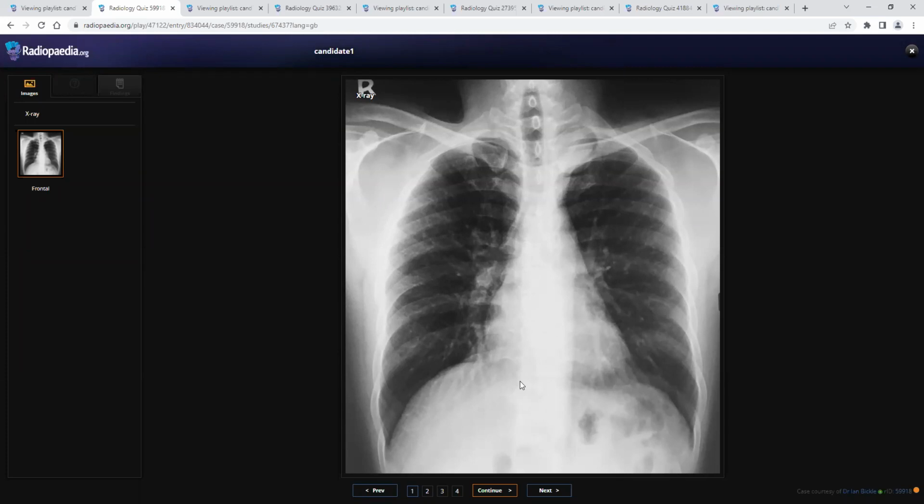We reviewed the previous chest X-ray. It was almost the same 5 years back also. I think I am going with a benign cause, maybe pleural lipoma or something benign, I must suggest in this setting.